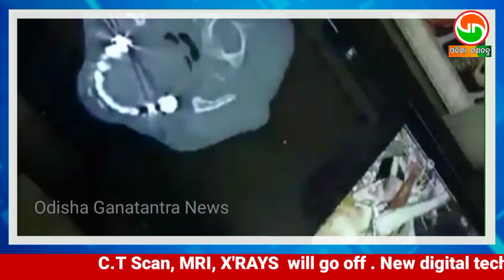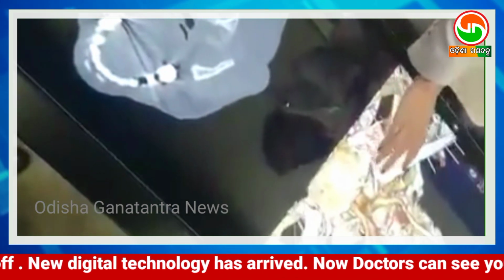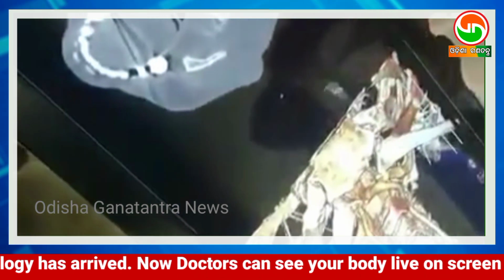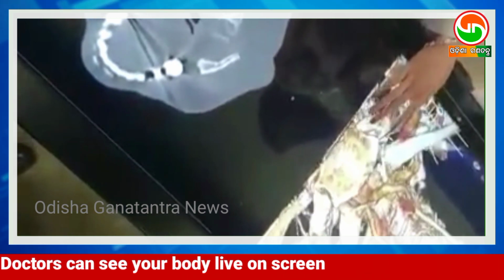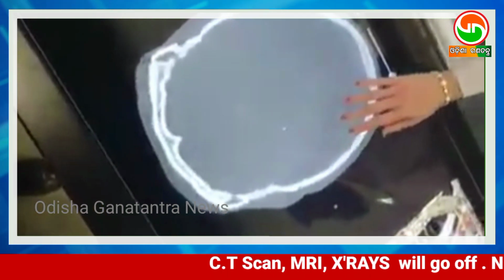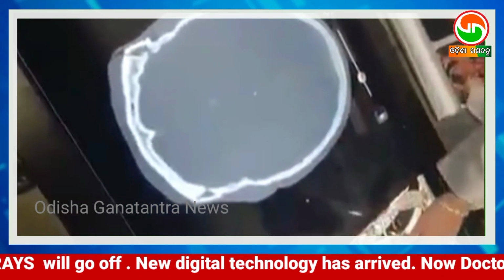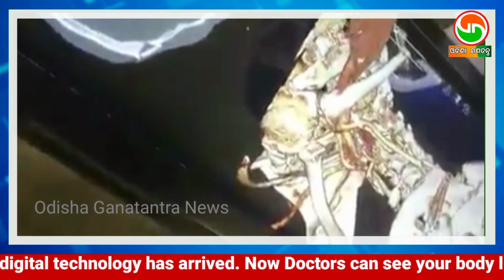And what's most interesting to me is you can load in your own patient's CT or MRI scans, and from there you can get a 3D model of what you see. So here we have a post-operative scan of a patient with a brain aneurysm, and this is the actual CT that was provided. You can go ahead and slide through the CT and see exactly where the clips were placed as well. So if I go down here, it'll show where it is here.